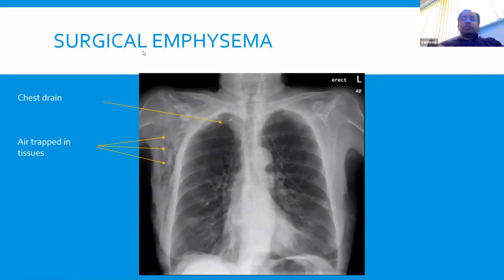So yeah, this is probably a case of surgical emphysema. Surgical emphysema is where you have air trapped in tissues. Well spotted. In fact, quite a few of you actually got it. It's quite prominent whenever you see it.